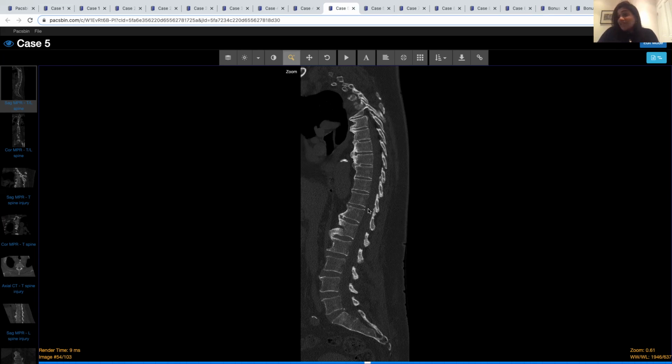They get fractures within the ankylosed segments, as well as at the junctional zone between the fused and the non-fused segments. And the longer the fused segment, the greater the risk of fracture. They're often 3-column injuries, they're often transverse injuries, and often the long segment of fused spine can act as a lever arm. Therefore, they can be very unstable. They're more prone to displacement of that mobile segment.